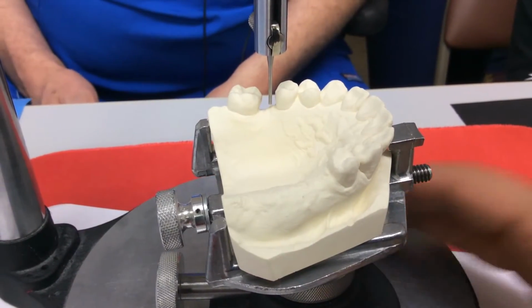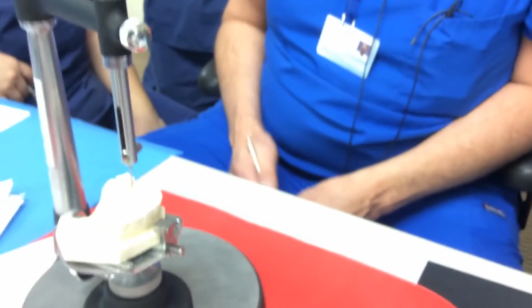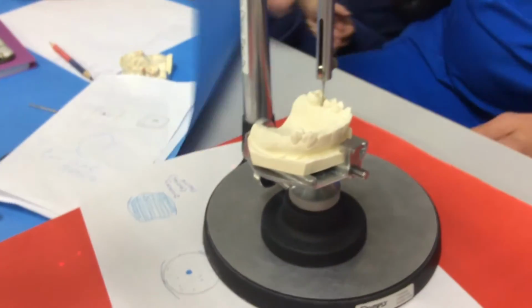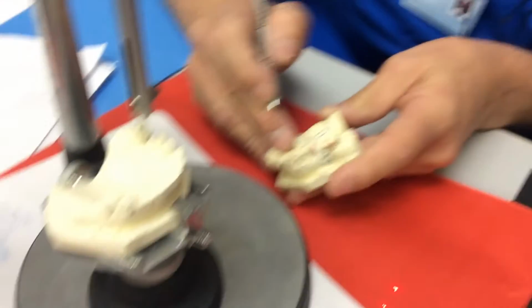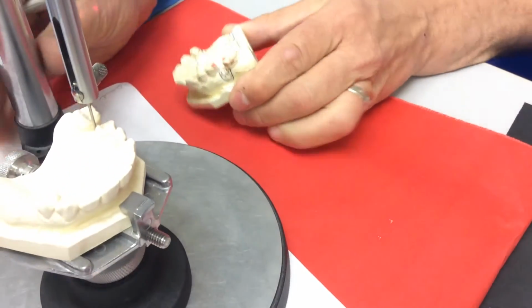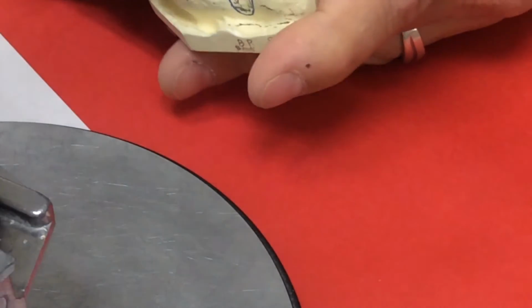After you draw your red square, don't forget to come up one side of it, across the top by the marginal ridge, and back down. It has to be incorporated into the framework. So when you look here, maybe, if I can get it into the picture, where did I go? Find me, I'm lost. There you go.